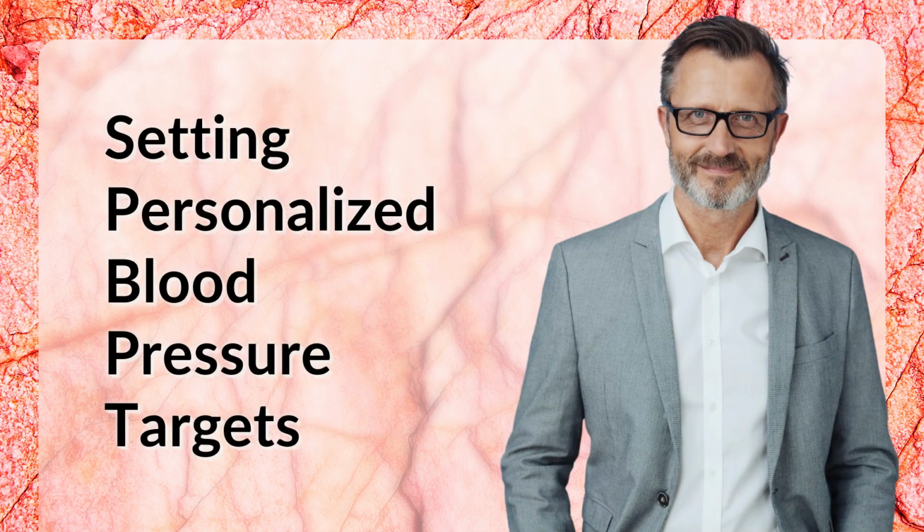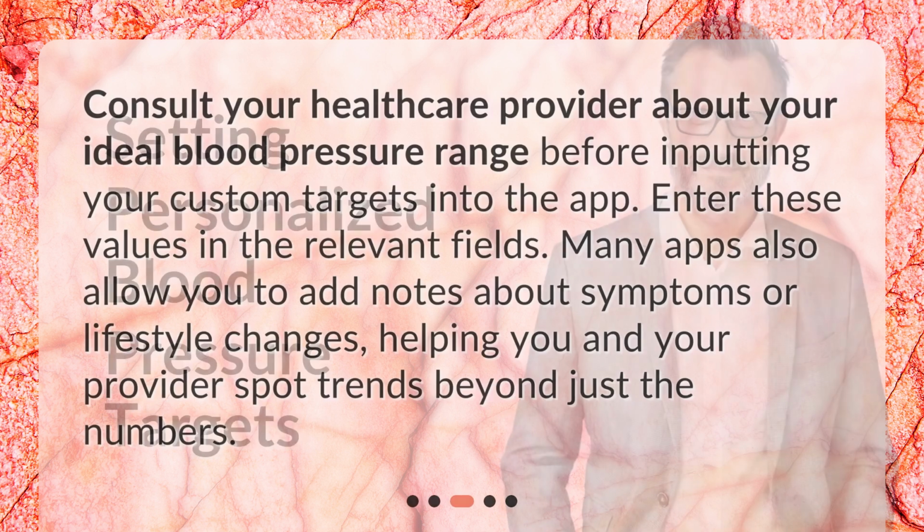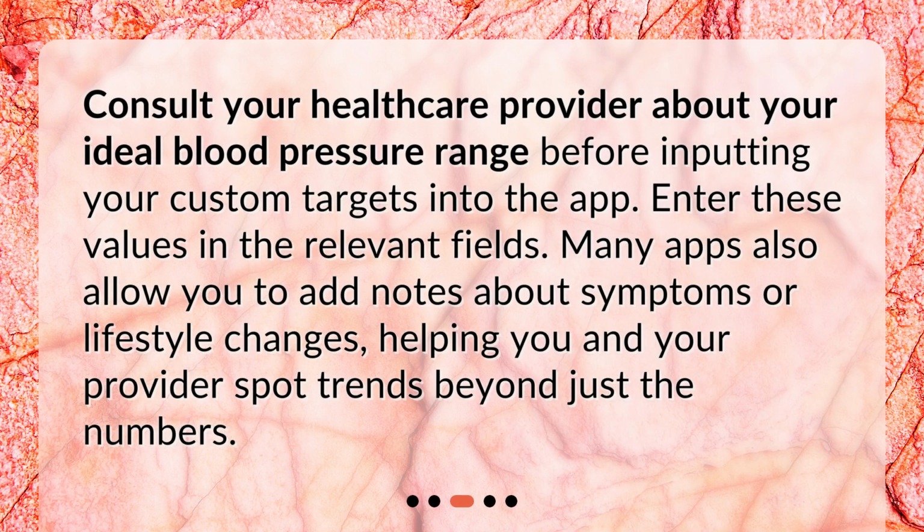Setting personalized blood pressure targets. Consult your healthcare provider about your ideal blood pressure range before inputting your custom targets into the app. Enter these values in the relevant fields. Many apps also allow you to add notes about symptoms or lifestyle changes, helping you and your provider spot trends beyond just the numbers.